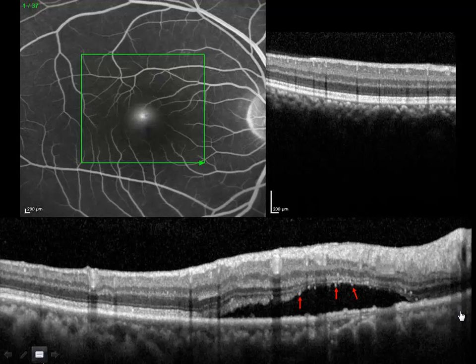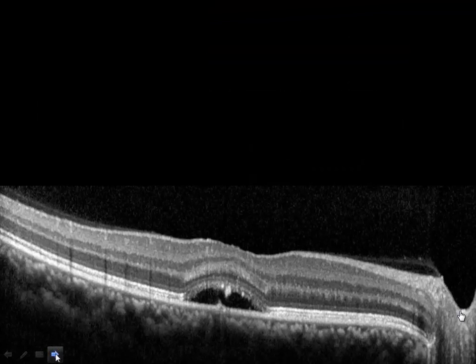This patient is showing a leakage on fluorescein. This is now central serous. And those dots are very typical, and it's the only condition where we really get the dots on the lower aspect of the neurosensory retina in a neurosensory retinal detachment. Here are some more of them.